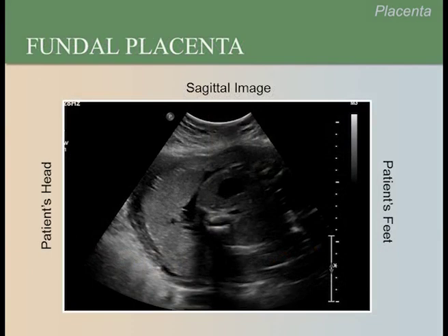This is a sagittal image. What is the placental location in this image? Please pause the video and ask a participant to identify the placental location. The placenta is at the fundus, or the top of the uterus.